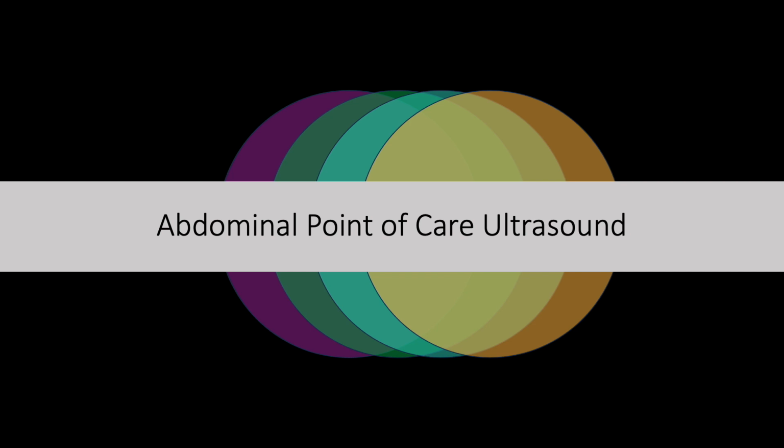Today, we're going to be talking about abdominal point of care ultrasound and looking at the normal anatomy in this lesson of these organs that sometimes we'll want to be investigating using our ultrasound probes.